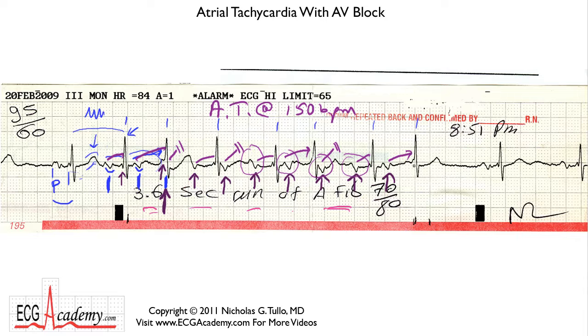Well, I guess it's kind of debatable whether there might be one buried in this QRS complex, but I don't think so. The P here is very wide. It's a wide P because obviously the patient has a lot of intra-atrial conduction delay. It takes a long, long time for this signal to get around the atrium, so the P wave is long in duration. And if it had started here, I think you'd probably see the tail end of it on this side of the QRS. So my feeling is that this is the last Mohican.